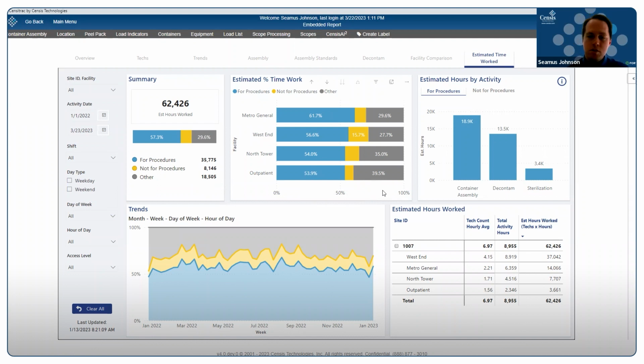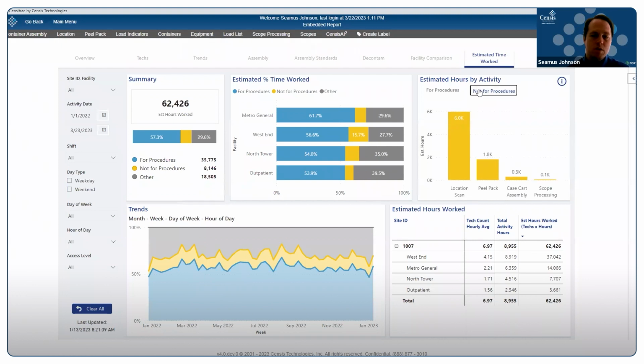One of the things you can do then is start to create barcodes for those activities in CensiTrack using our efficiency task module and pull that in. And when you do, you'll be able to start to measure here in this Pareto how much of your department's time is spent doing those things.